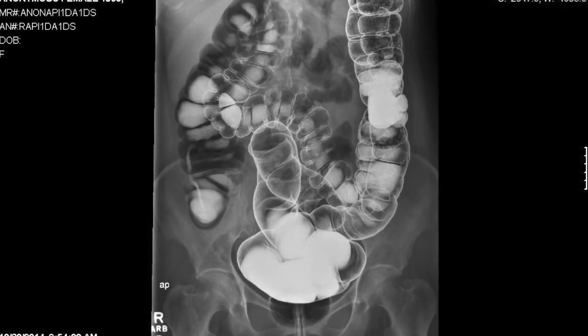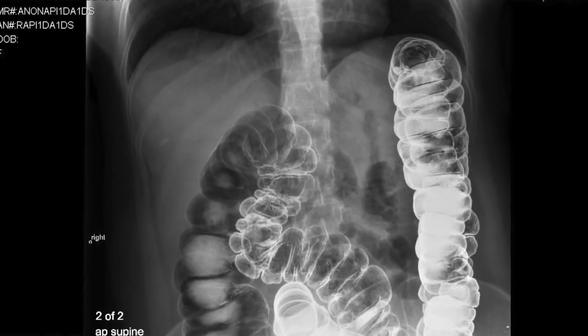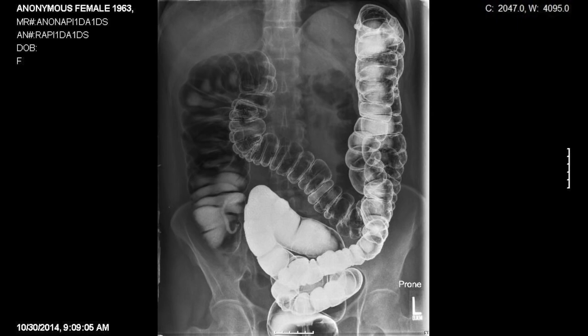Overhead images are taken by the technologist after the fluoroscopic portion of the study is completed. These overheads help piece together the spot images and provide the overall big picture of the examination with minimized magnification.